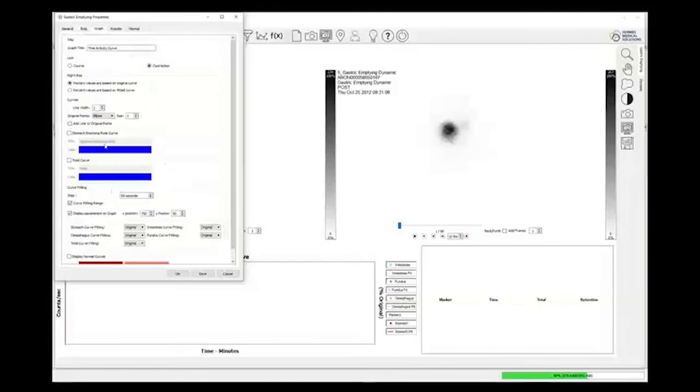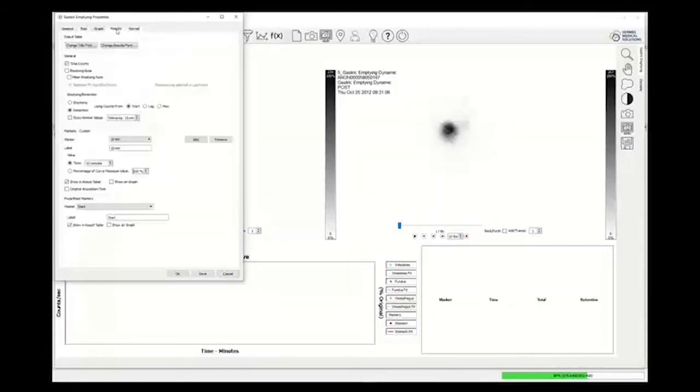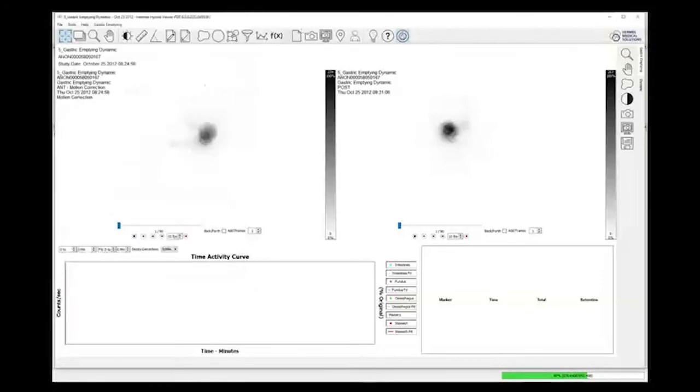Similarly as well, where is it? We've got some extra markers. Sorry, whereabouts? Oh, here we go. Again, we've got some extra custom markers that I mentioned before. So lots of configurability here, and obviously you can add in more as your heart desires.